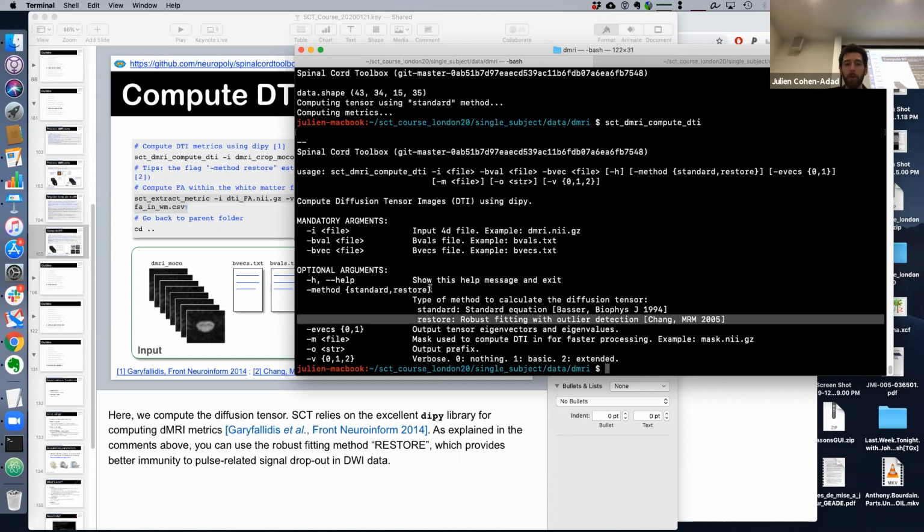It's just for information that there is this possibility to use another algorithm. Well, if it works well, definitely it should be the default. It's just longer to run, and some people also don't mask the image, so it might take a lot of time to do a pixel-wise analysis. It would be easy to implement the weighted cost function just using the mask.